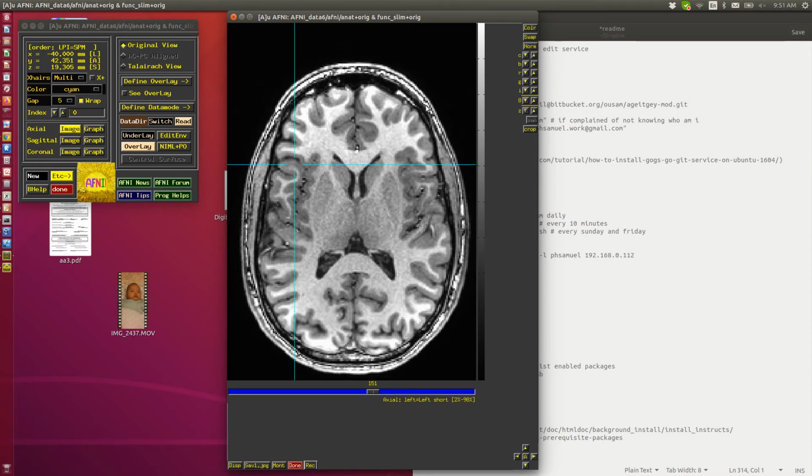Okay, so let's have another quiz. Suppose I drag this image window to be bigger, like that. So now there's a bunch of unused space in the image window. How can I expand the image part of the image window to be bigger? It's another button on the right side. This will require experimentation, perhaps.